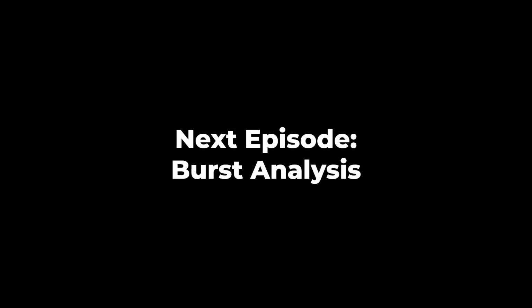I hope you found this video helpful in using LabChart to do spectral analysis.